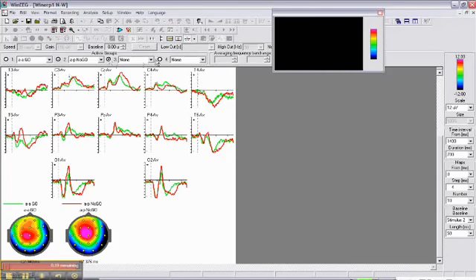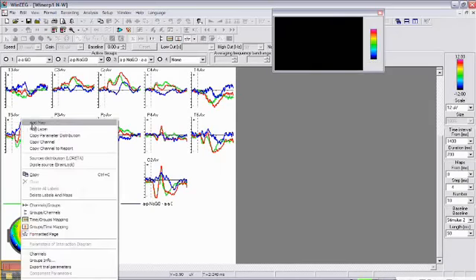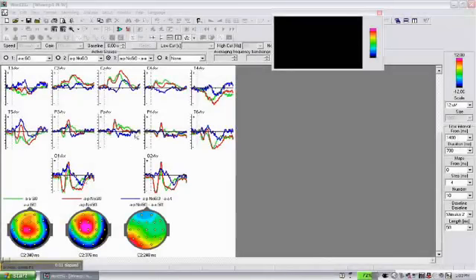And we can also compute the difference between go and no go condition, and map the difference between go and no go condition. So everything looks quite okay. So we computed ERP that we can see after the second stimulus presentation. Green is go condition, red is no go, blue is the difference between go and no go condition.